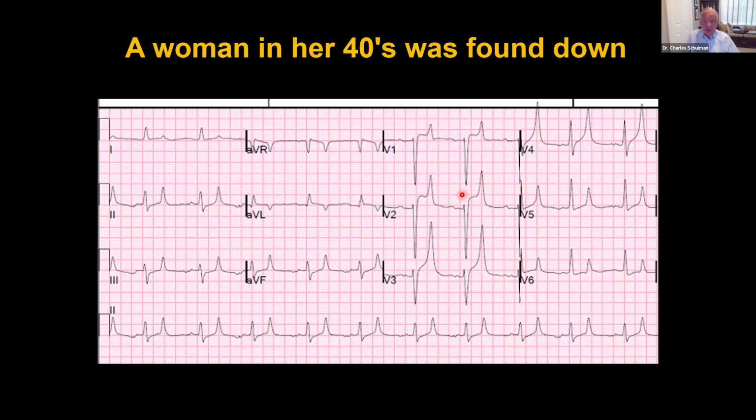So here's a woman in her 40s who was found down, brought to the emergency room, and this is her electrocardiogram. What do you think of these T waves? Yes, yes. This is hyperkalemia. Yes, you all got it right. This is hyperkalemia, all right.